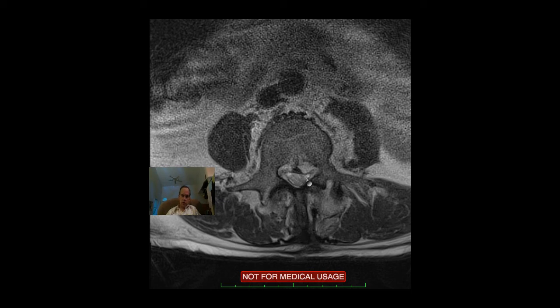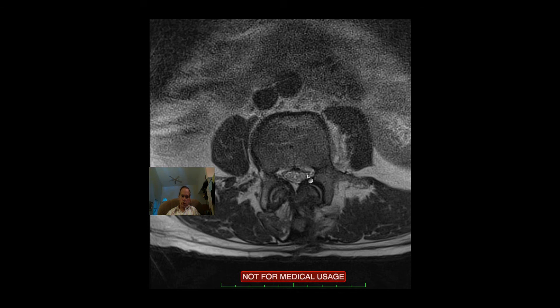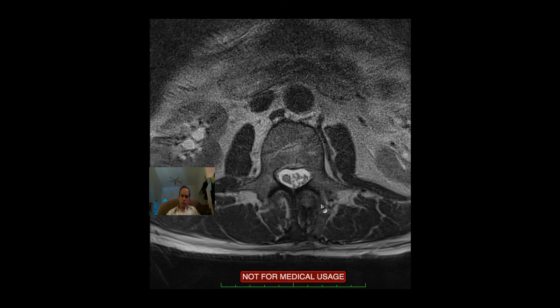This is showing all the nerve roots, the cauda equina seen cross-sectionally at this lumbar level. And you can see each of the individual nerve roots pretty well, and you can also see how this cauda equina, this central canal, this spinal canal, is easily compromised by facet joint hypertrophy from either or both of these facet joints.